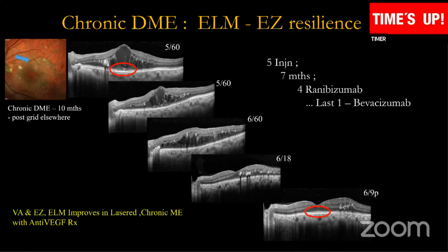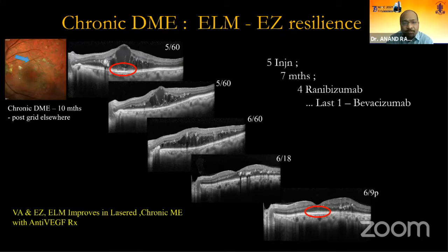The BRBs and the outer retinal microcosm nexus, I'll just put it in short. In diabetic macular edema, the pathology comes from the top down. So the DRIL and the IPL-INL area is affected first compared to the ELM. In AMD, it's the other way around.